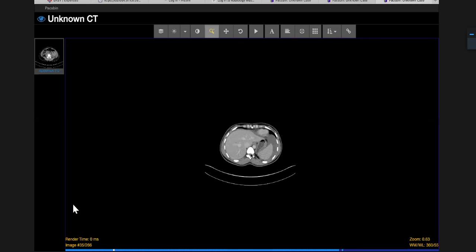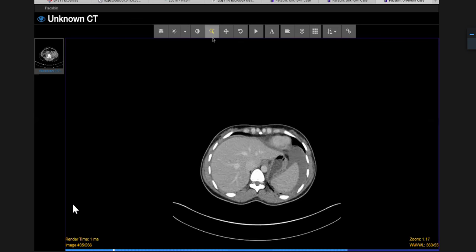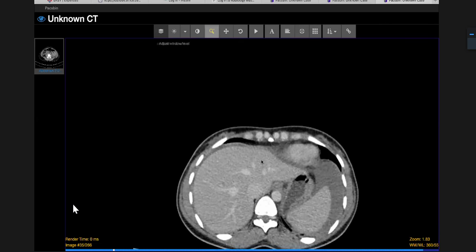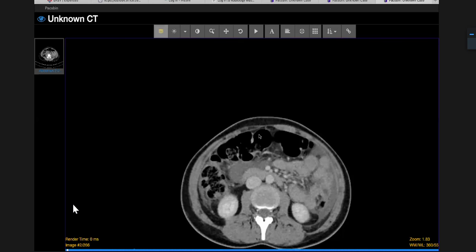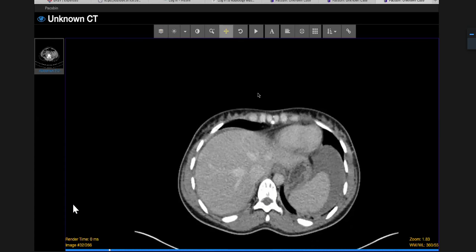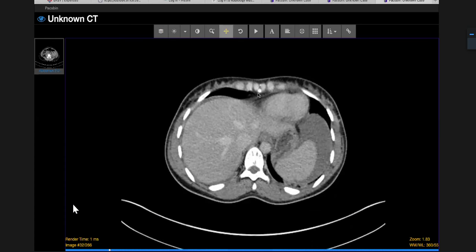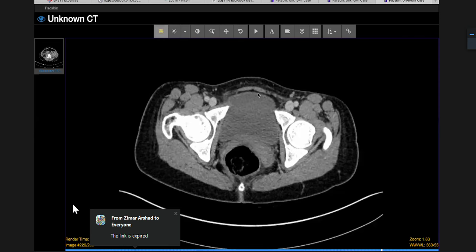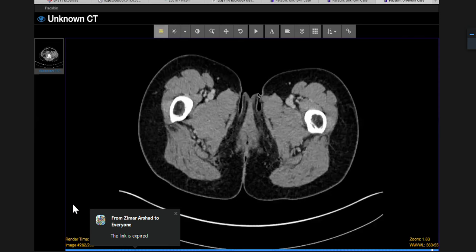Osteopenia, reduced intercarpal and PIP joint space and soft tissue nodules can give differentials as RA. But I don't think so. They had generalized osteopenia. It's not very periarticular, which is what you see in RA. And again, those erosions are not typical for RA, so I wouldn't really give RA as a differential. Again, in the exam, sometimes there is only one diagnosis and not many differentials.